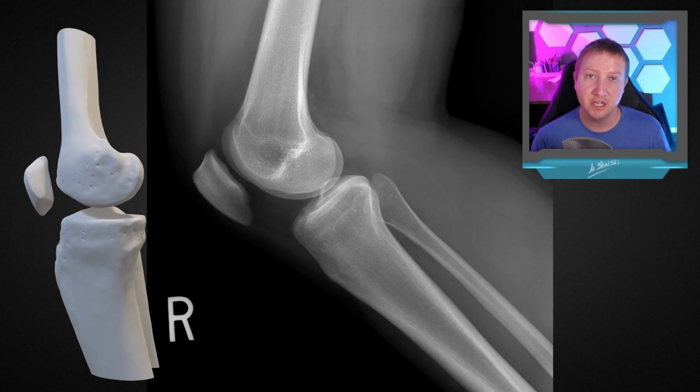All right, and so that intercondylar region that we saw on the A to P view, we can see really nicely on the lateral view as this dense sclerotic line. So this is the roof of that intercondylar notch, and this dense line we call Blumensaat's line. And then notice on the lateral femoral condyle, that condylopatellar sulcus we saw in the A to P that I pointed out, that's that little divot here. And we do actually look at this closely on our lateral knees because if that's too deep, that could be an impaction fracture from a pivot shift injury, which could indicate an underlying ACL tear.